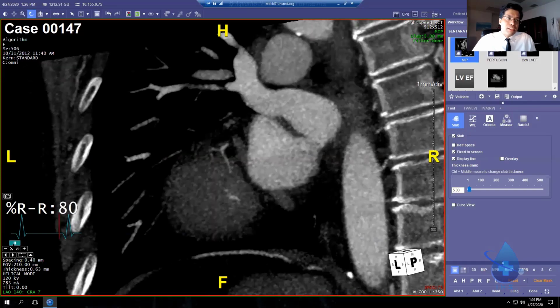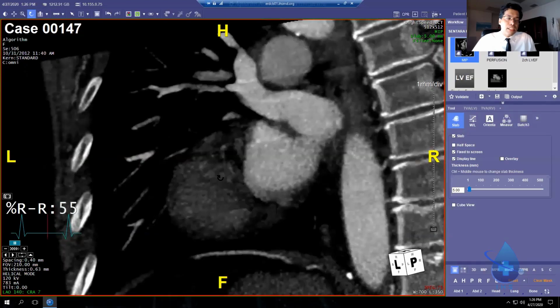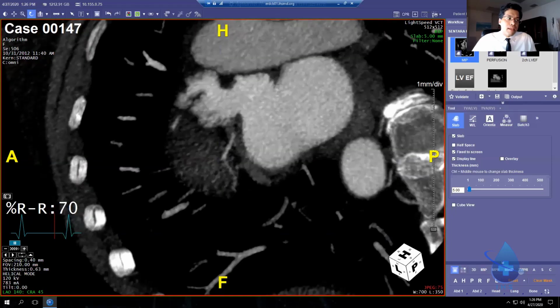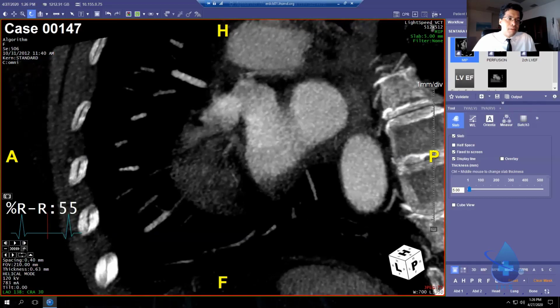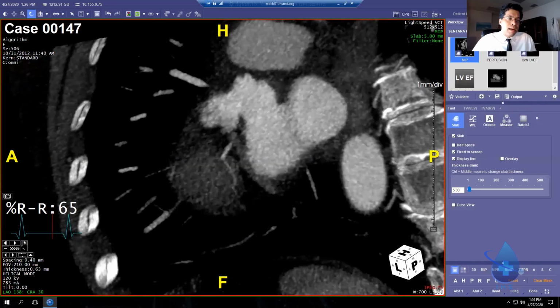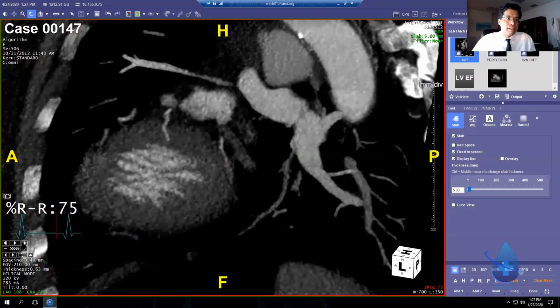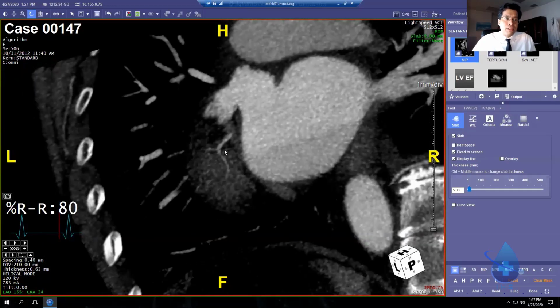If you want to change phases of the cardiac cycle at any time, you can. You can also play it in cine mode if you want to look at an old school kind of angiogram. But that's normal, and that will come with experience, meaning in a few days after you look at a couple of caths. There's a bunch of caths in your correlation files. I want you to look at that circ that gets cath, non-culprit vessels. When you look at the cath, you'll see that's normal all day long.